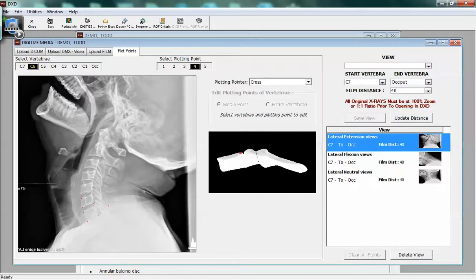Now you're going to C6, always the same order. Spinal lamina line. Now we're on C5. Same order. We're always going from the posterior inferior corner to the anterior inferior corner to the anterior superior corner to the posterior superior corner to the middle of the spinal lamina line. Now we're on C4. You can see that this is tracking us at C4 right above here.